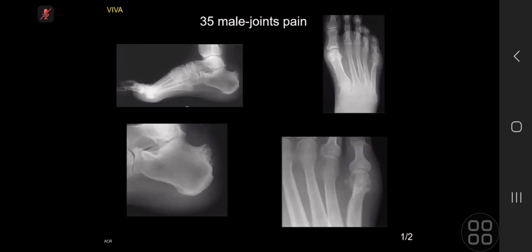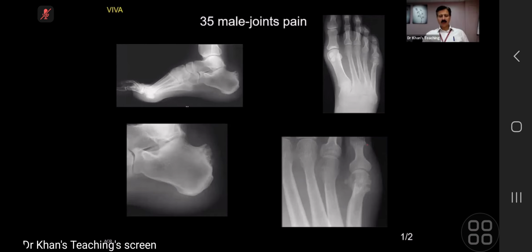Seronegative arthritis is possible. Okay. What about RA, as in rheumatoid arthritis? It's a relatively unusual patient for RA. I suppose I should mention that the bone density is preserved. Okay. Apart from obviously the eroded parts. Okay, excellent.